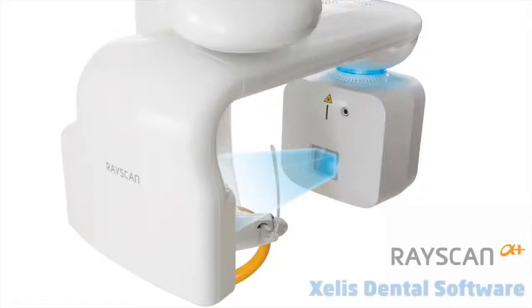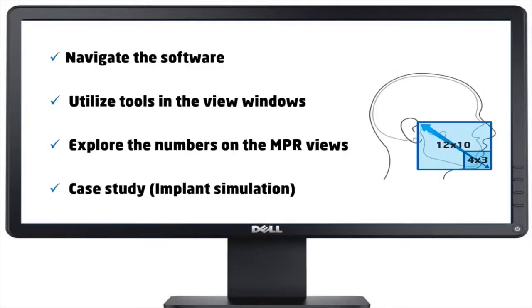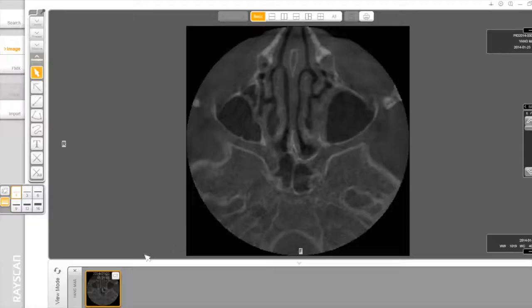Introducing Xelis dental software. This video is designed for new employees, self-paced training, and provides how to manipulate the 3D viewer scanned from RayScan Alpha Plus. By the end of this video, you should be able to navigate the software, utilize tools in the view windows, explore the numbers on the MPR views.